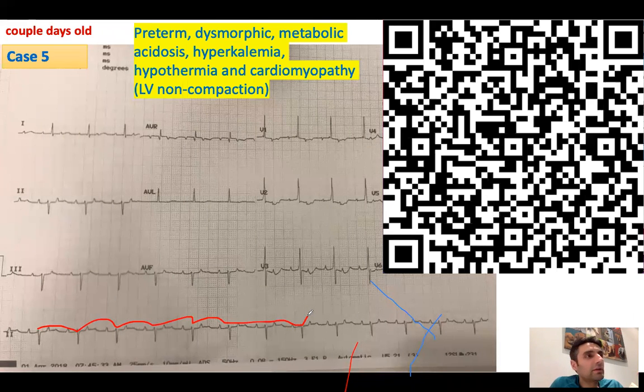First degree heart block is 1-to-1 conduction with fixed PR prolongation. So the question is, do we have 1-to-1 conduction here, or a higher grade AV block? This is his sinus P wave. There's definitely something funny in this T wave.